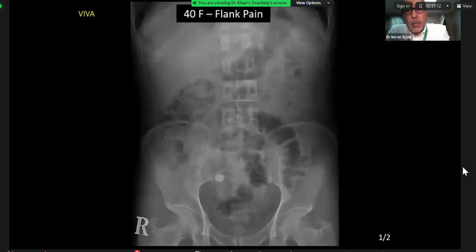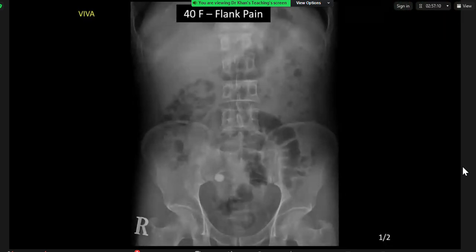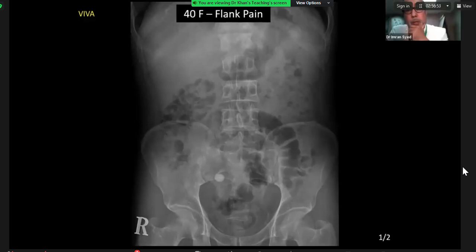Let's concentrate on the pelvic region. What can you see here? So I can see a subtle area of gas around the bladder, or the bladder outline appears to be, I can see some calcification perhaps within the bladder wall. Okay, so describe that. What can you see?